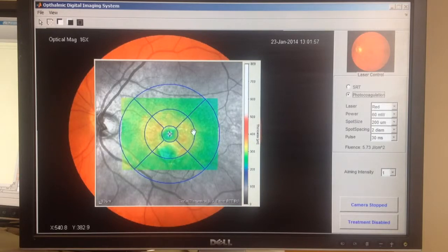This is a relatively healthy eye. Well, this OCT color map is not from the same patient. Is that right, Mark? No, it is. It is. That's right. That's why all the vessels and everything line up. Okay, so now let's say you want to do a treatment.